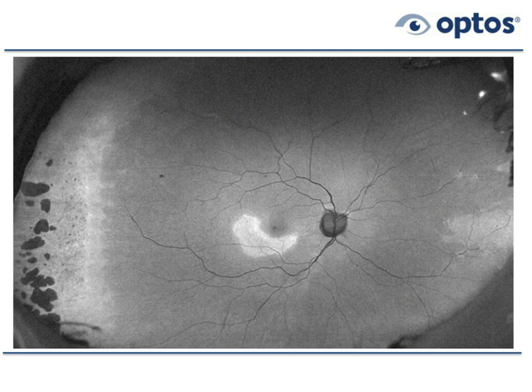And if we go out temporally, we can see what looked like the paving stone as the dark lesions, but there's a bright band in front of it, which is sort of perhaps marching towards the posterior pole. So those kinds of bright bands in the far periphery don't occur with a standard condition like paving stone. So this is actually a form of retinitis pigmentosa.